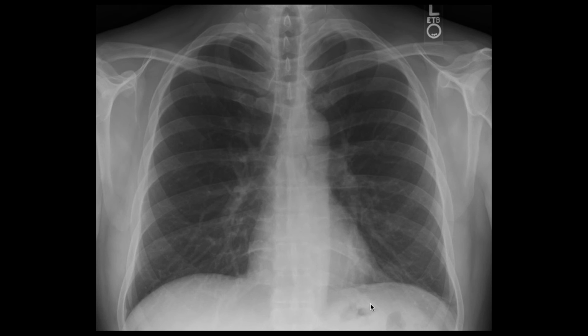There are no obvious soft tissue abnormalities, and I see no obvious bony abnormalities either. Now, one could report striking abnormalities. However, in this radiograph, I see no striking abnormalities. This leads me nicely to a summary and conclusion.